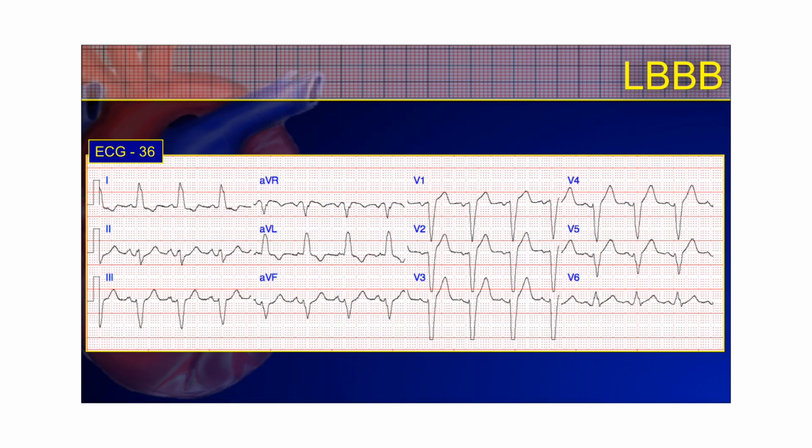Sure enough, I have another one for you. Nice sinus rhythm. Aberrancy, left bundle pattern in V1, V6, and lead 1. And we do have ST elevation in these right precordial leads, and maybe some depression in some other leads. I see maybe a little bit in aVL, maybe a little bit in lead 1. Okay, so it's just like a left ventricular strain pattern. In fact, you can call it a left ventricular strain pattern because it is the left ventricle that's being blocked. The conduction is moving much slower through there. It's just a different pathology.